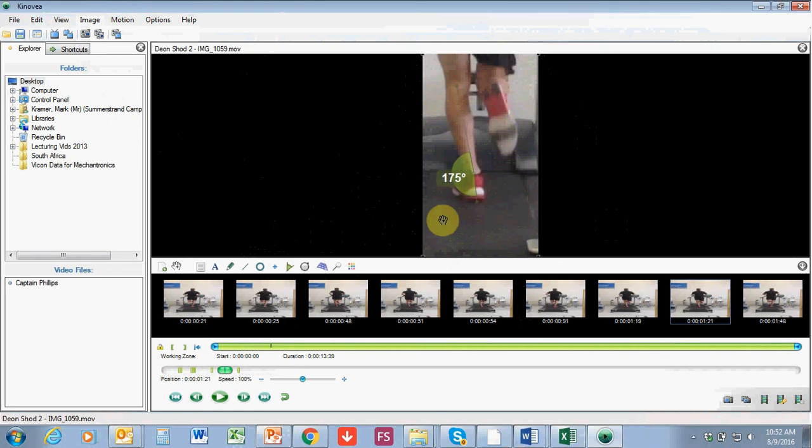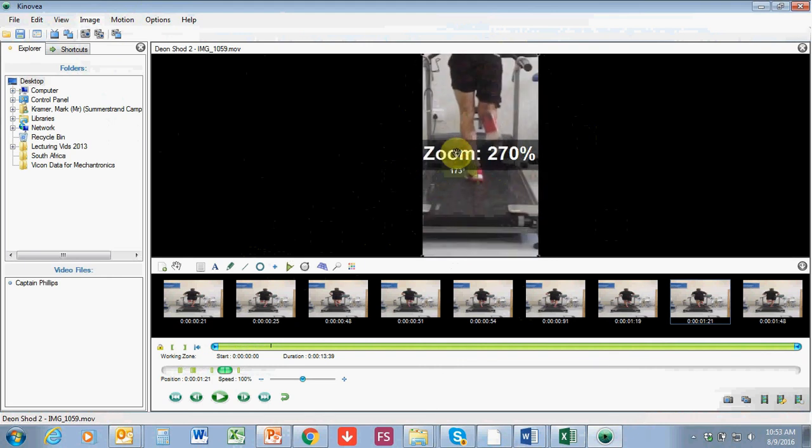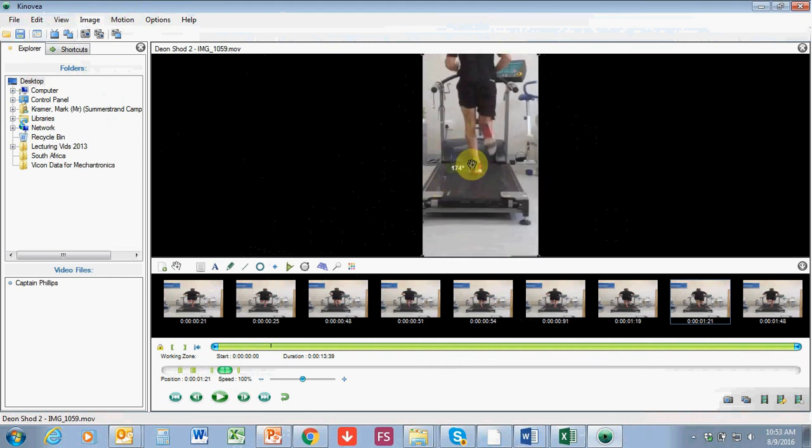We said, remember, within 5 degrees is pretty normal, so this one is a little bit more stable again than it was on the right hand side. So screen capture this, use it for comparative purposes. Alright, zoom out again. We'll delete. The next part that we'll want to look at is that lower leg rotation, so just shy of that. Let's look at that angle.